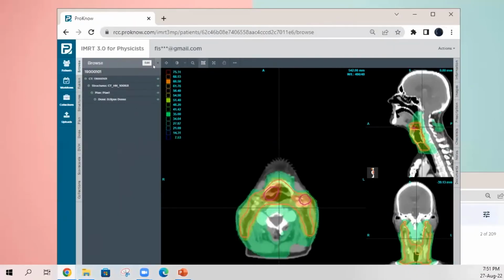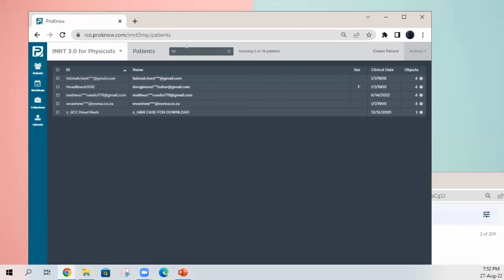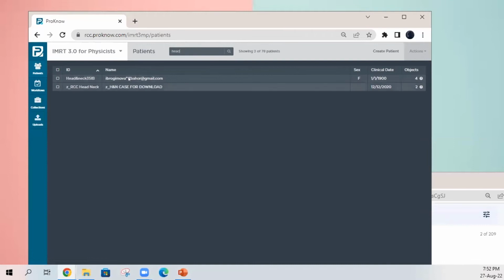Okay, so browse. Yes, here. So this is the name of the plan. Just a second. Okay, so this is head. Yeah, this one.